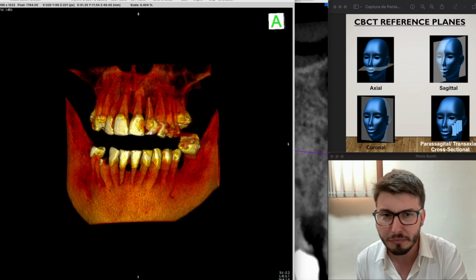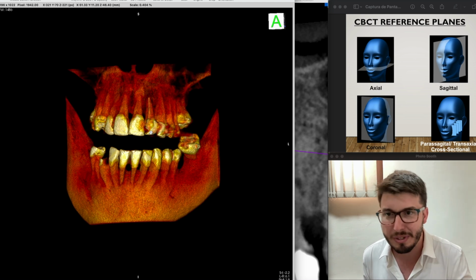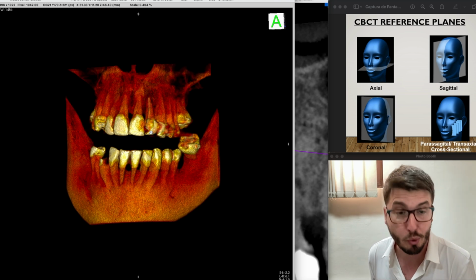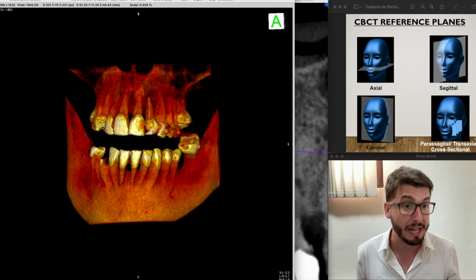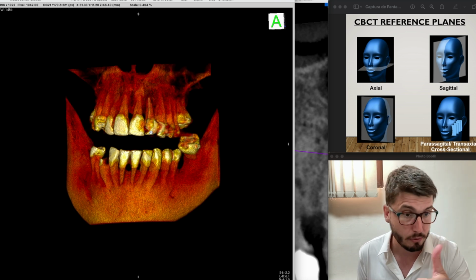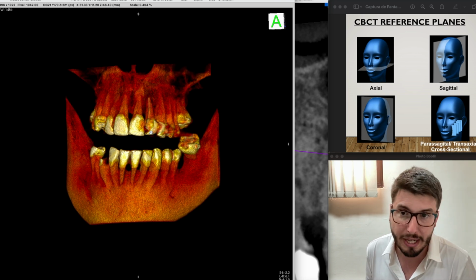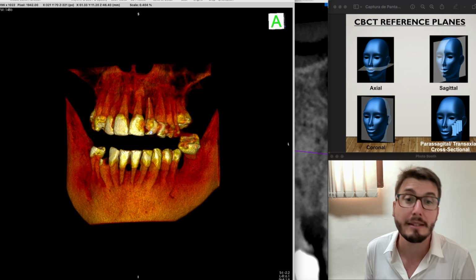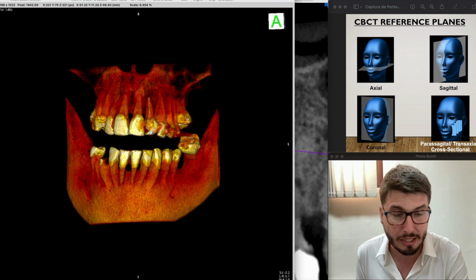All right, so a very nice case, at least for us to comment and study a little bit about the case, at the same time that we understand how to diagnose a supernumerary tooth. Should we take a CBCT? Well, especially for the surgical plan, yes. Always when we need 3D information or radiation guidelines, we will allow you guys to take a CBCT because now it's very important, not only to diagnose, to see proximity to structures in 3D, and then to plan the surgical retrieval of this tooth. Okay, if it's part of your treatment, of course.